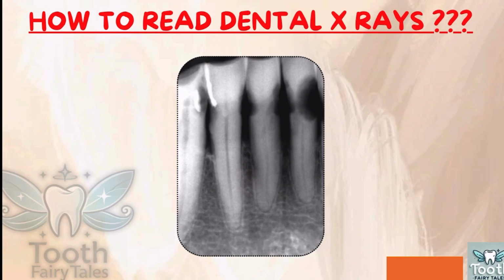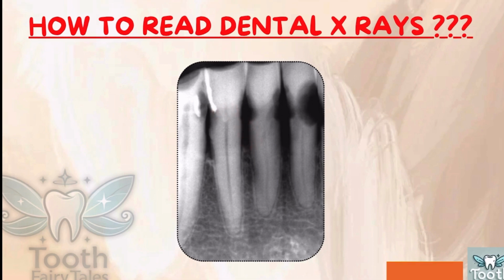And you can see the shadow here. Why do we see a shadow here when there is a receding bone? Usually the bone level is until the neck of the tooth. When it recedes, you will see the shadow here. And this is why the dentist recommends x-rays.